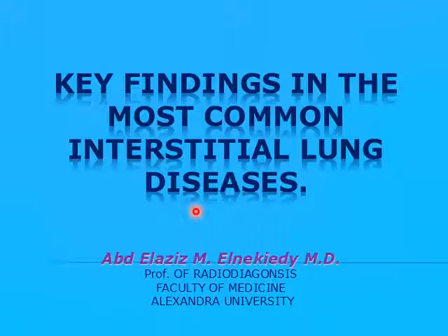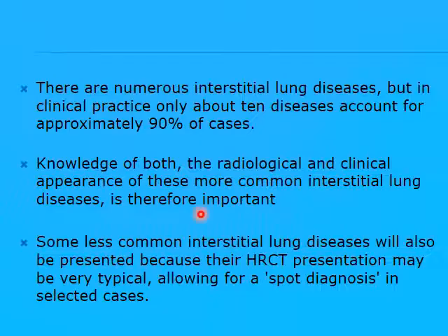Today, the key imaging findings in the most common interstitial lung diseases and in other lung diseases. There are numerous interstitial lung diseases, but in clinical practice, actually 10 diseases represent more than 90% of cases. Knowledge of both the radiological and the clinical appearance of these more common interstitial lung diseases is important.